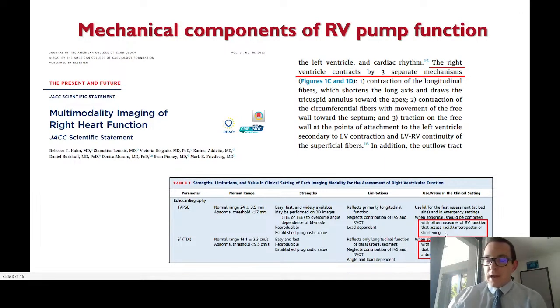So this clearly highlights that these have important clinical consequences. However, we can assess these mechanical components only by three-dimensional echo and by our ReVISION software, which can actually quantify the relative contribution of these components head to head.